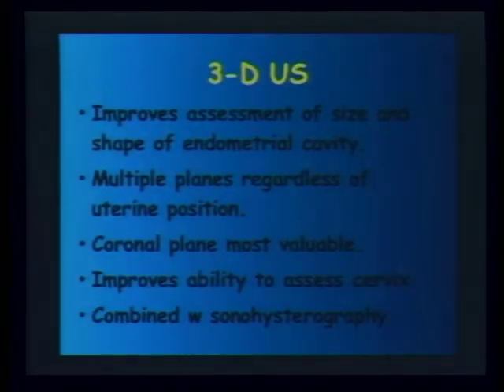3D ultrasound has the advantage of improved assessment of the size and shape of the endometrial cavity, multiple planes regardless of the uterine position, and the coronal plane is the most valuable.